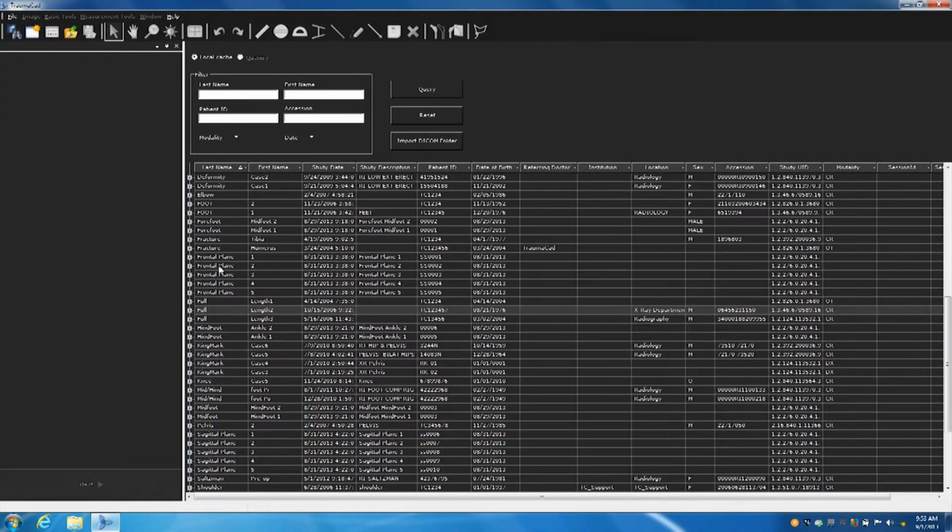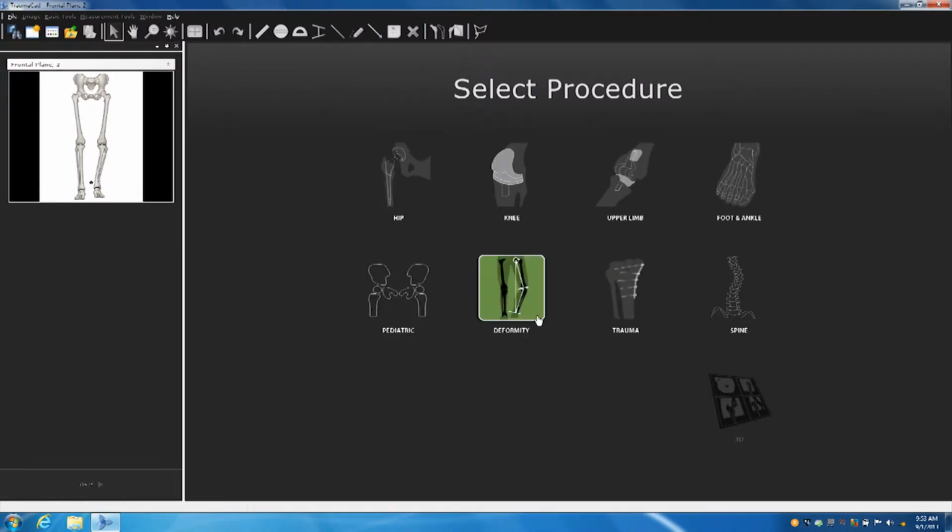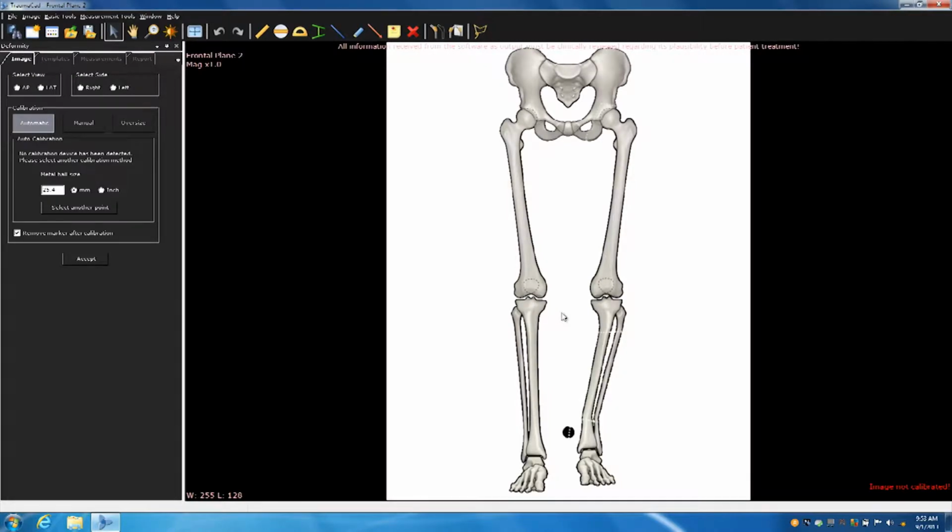Do frontal plane 2. Let's go to another schematic and we'll go very slow. If this is becoming quite intuitive for you, roll right ahead, map your ABCs, and see how you do. Raise your hand for those of you who are still trying to figure out what I'm doing, I'm going to kind of gear it down a little bit.